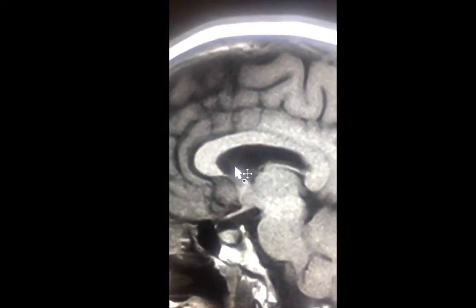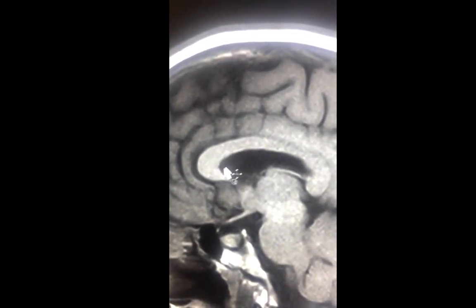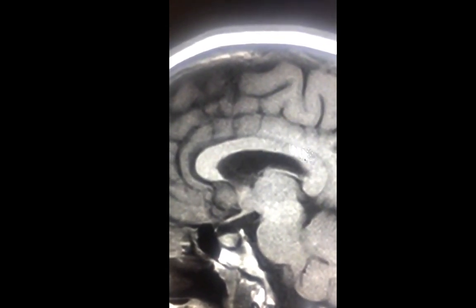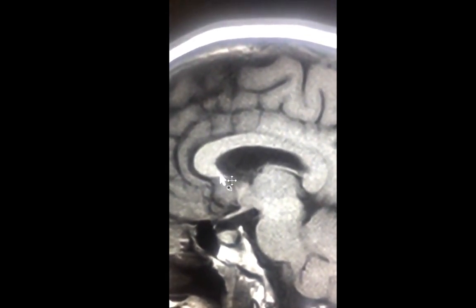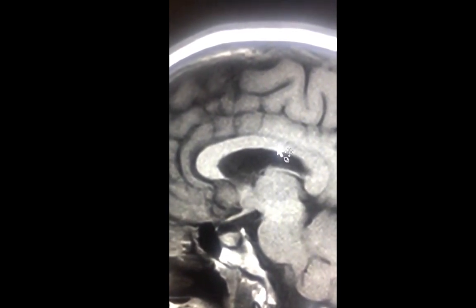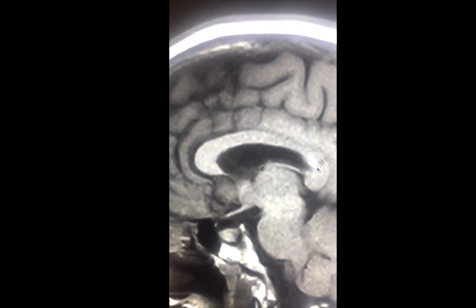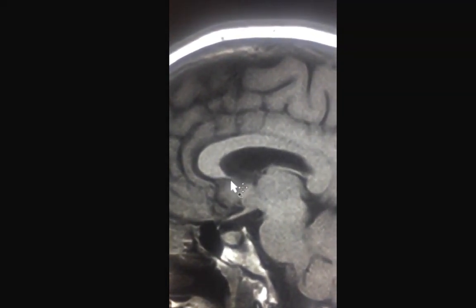In cases of intrauterine partial agenesis of the corpus callosum, you should not see the rostrum, meaning that you could see a genu and part of the body with absence of the posterior components and absence of the rostrum. If the rostrum is present and there is any abnormality in the corpus callosum, that means that the abnormality occurred after total development. So with partial agenesis of the corpus callosum, you'll have absence of variable degrees of these components in addition to absence of the rostrum.